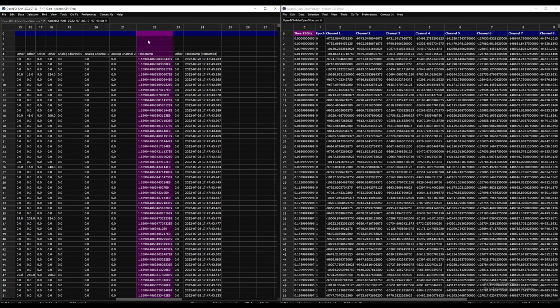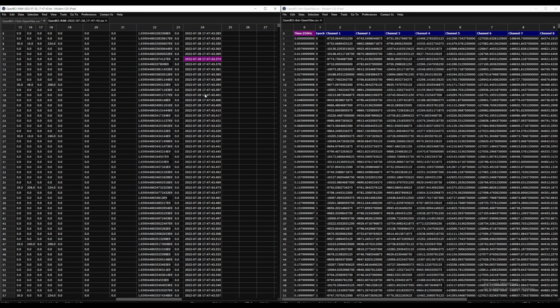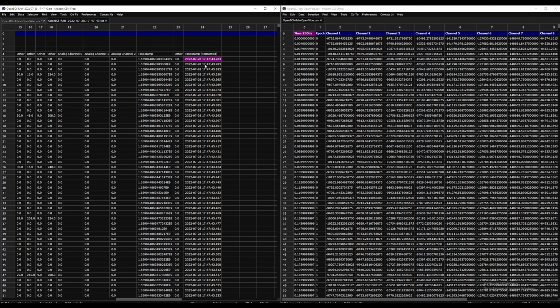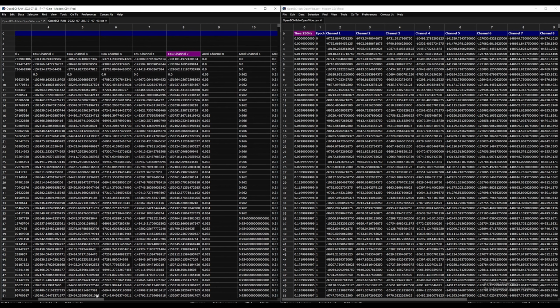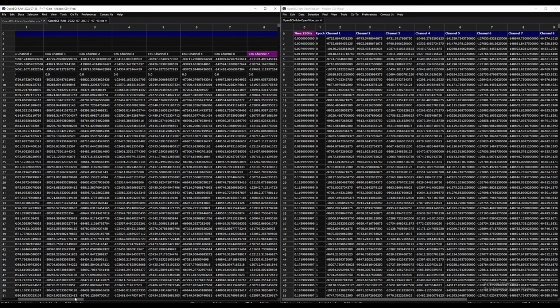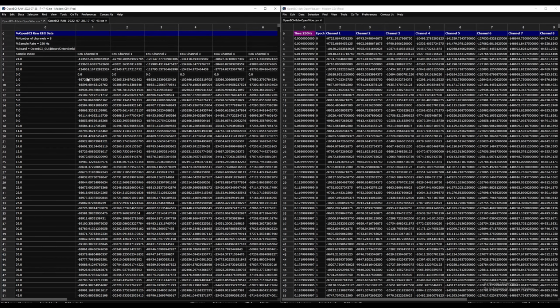And there you have an actual timestamp column in 2 different formats, which of course will not have the neat distance between them, but they really wouldn't matter in the end, because at the end of the day, you have samples that are assumed to be taken at regular intervals. And the speed that you recorded it would be the speed that you would play it back. And that's the heart and soul of any sampling. So let me show you.